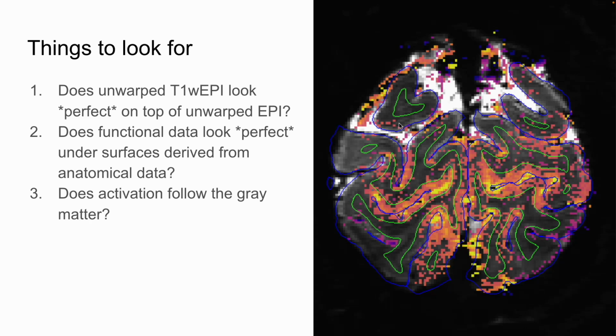structure, and your signal to noise ratio goes through the roof. You've never seen such gorgeous data. But then your activation blurs all the way through your slice volume. So you look for things like that as hallmarks that something has gone horribly wrong in my data analysis. And so if this had been NORDICed the wrong way with a not true noise sample, then you would see big blobs of activation instead of just the occasional false positive showing up in the white matter.